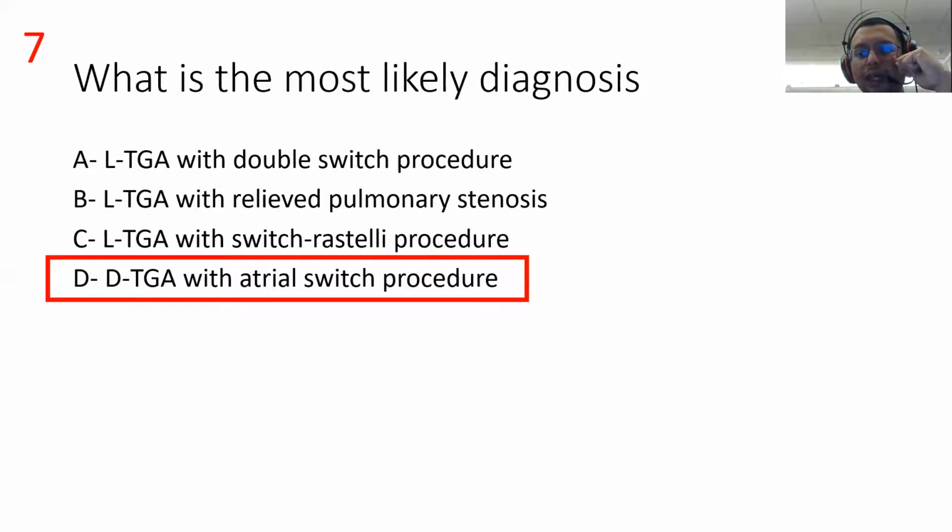All right. So I mean, at least even though the echo is difficult, do you understand the concept or not, at least? Yeah. Really? I've got a question. Yes. In TGA, they will have systemic RV, right? So if you say you have TGA, what kind of TGA are you talking about? Both, right? Yes, correct. So let's talk about it a little bit.